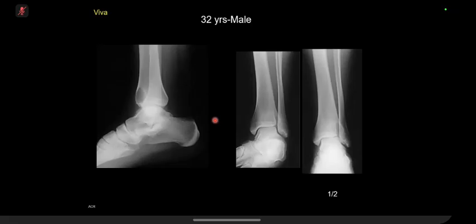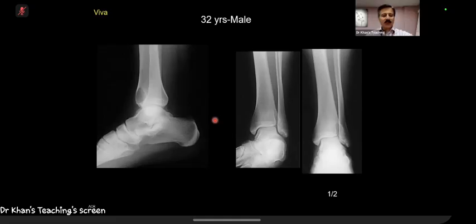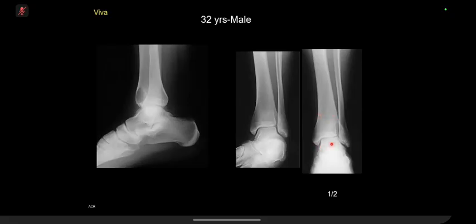So it has a narrow zone of transition, a benign lesion in this location, which is not entirely epiphyseal. I would include a hint. Reconsider. Has it gone into the epiphysis? It is epiphyseal, sorry. Right? Yeah. So epiphyseal, so it is a subarticular location. So I would consider giant cell tumor as well because the epiphyses are closed.